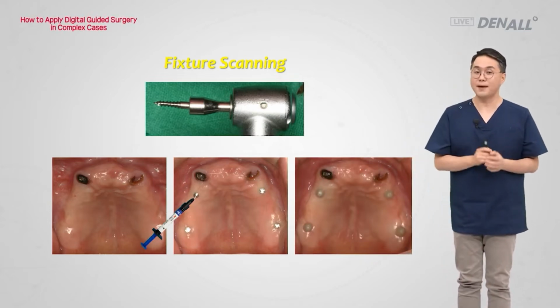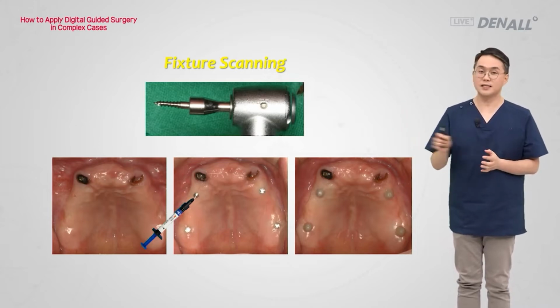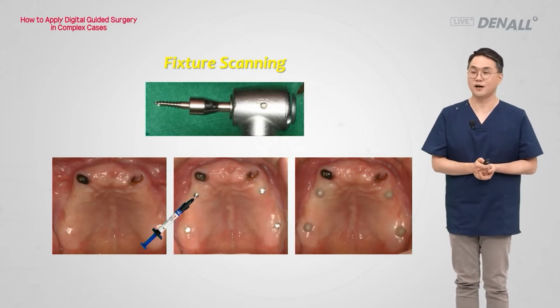That means the metal of the ortho screw head is shielded against blurring and scattering, and the flowable resin plays the role of radio-opaque markers, which are attached in the shape of teeth.